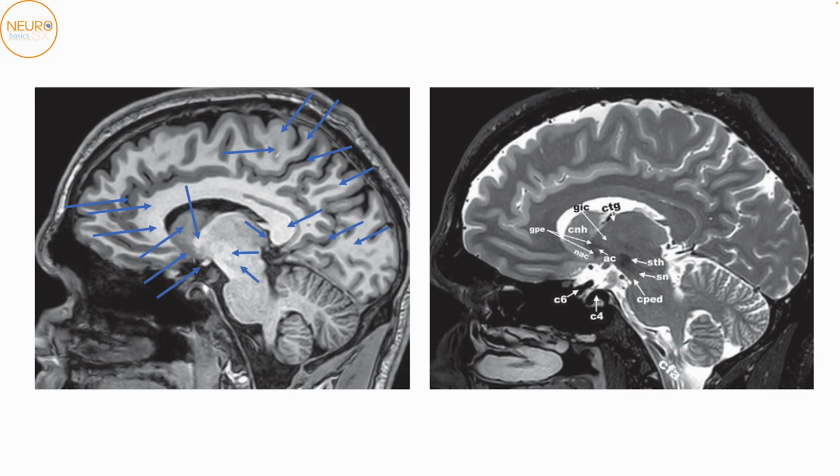Okay, so as we come closer and closer to the midline, the structures become more and more obvious and a lot easier to identify. So again, thick, thin, you've got the pre and the post central gyri. Okay, another way to identify this would be using the cingulate sulcus. So as we're getting closer and closer to the midline, the cingulate sulcus will become more and more obvious.